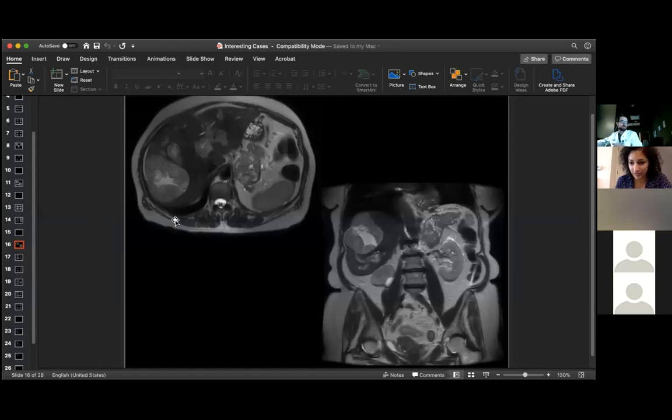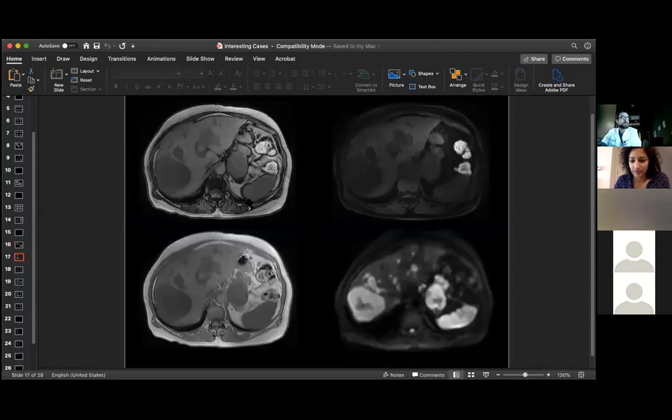And something in the left side of the abdomen. Yeah, so Gaurav, a potential Met on the left side, which Amar also sent me, and Rupa's asking about the pancreas. So on the coronal, the shape is like, is that the pancreas or is that the adrenal? Right, okay, perfect. So is it going along the splenic vein? Right, so I'm gonna show you some additional images. I'm just showing these for the liver findings first, and then I'll show you with respect to the pancreas.